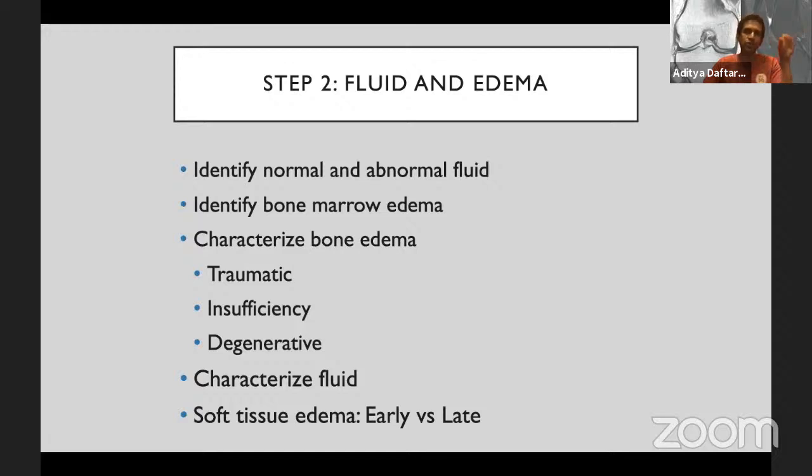Do you think this is from trauma? Do you think this is from insufficiency? Do you think this is degenerative? And then you characterize the fluid. And then we're going to mention a little bit at the end of this on soft tissue edema, and that we're going to talk about timing of MRI scans and how that makes a difference to what you read.